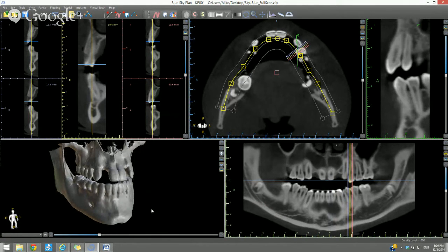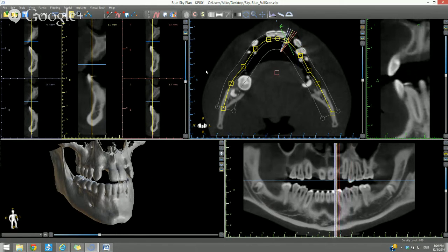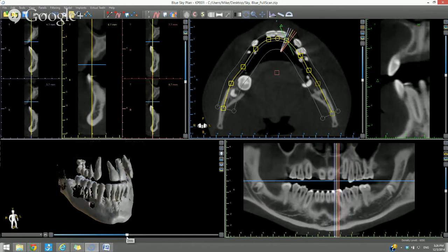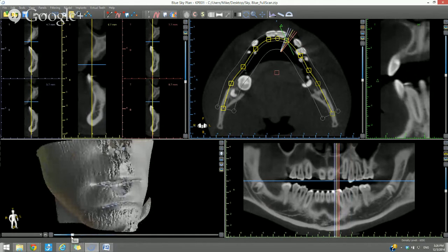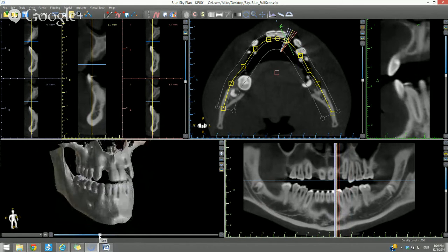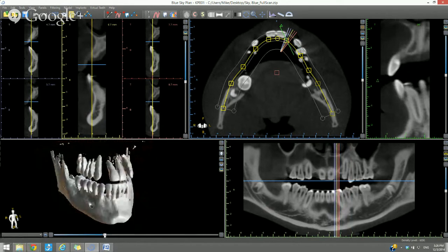Oh, one more important thing about the 3D view is the slider on the bottom. Generally, the sliders on the side of the 2D views are to go through the different slices. The 3D view obviously doesn't have slices, but the slider is our density threshold. If we raise the density threshold, we'll see less anatomy, only the more dense anatomy. And if we lower the density threshold, then we'll include even the less dense anatomy, and you can even get to the patient's face and skin. The drop-down here has some defined presets: bone, skin, tooth. It's the same as moving the slider. It just jumps the slider for you to some popular values that will show you different parts of the anatomy.